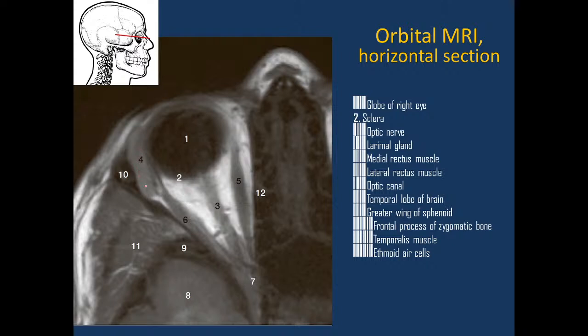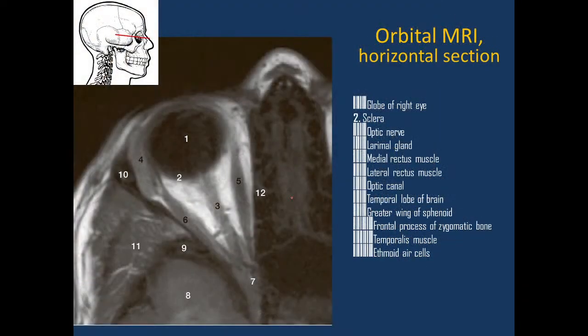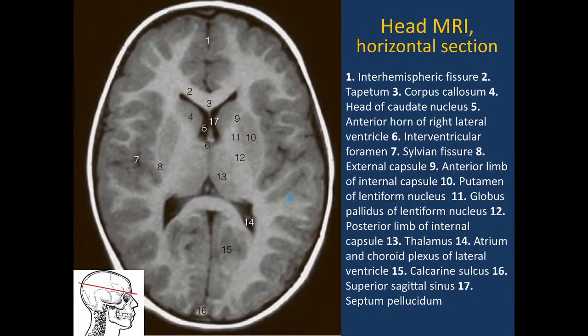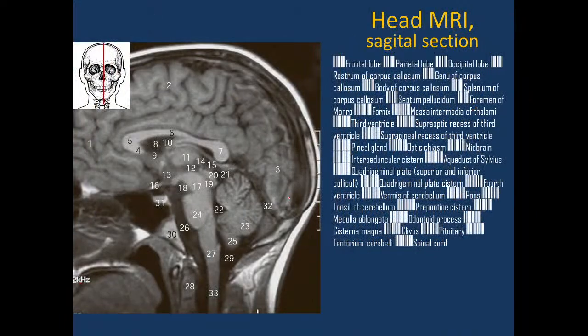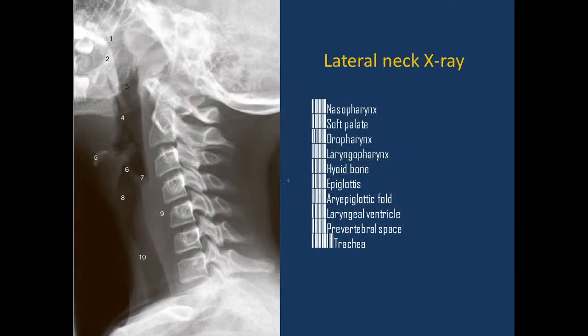Orbital. Let me take another picture, because you didn't study organs of sense and the central nervous system, so we will see this picture later in the third semester.